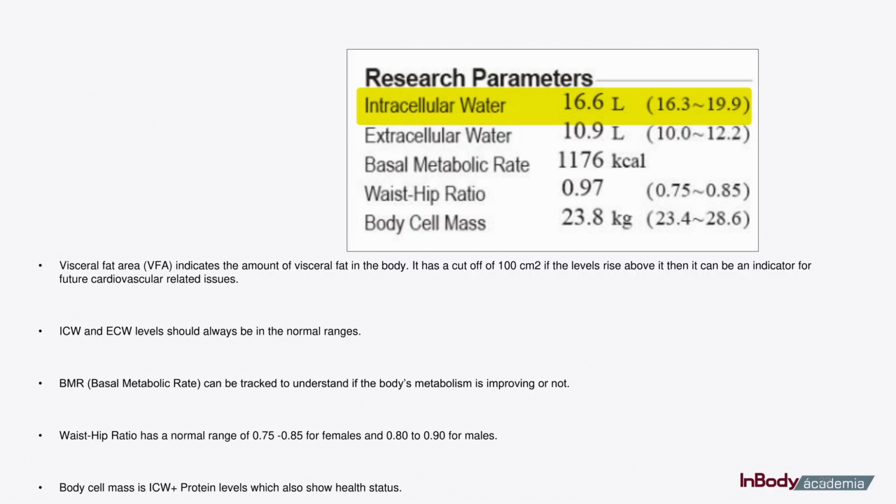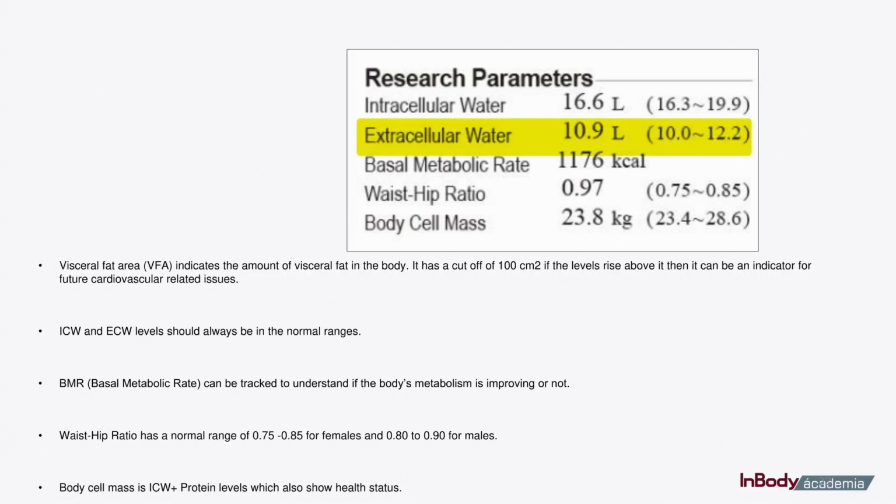Talking about the other research parameters, through the InBody report, you can actually understand how much intracellular water is present in the body. Intracellular water is the water which is present inside our cells. And also you can make out how much extracellular water is present in the body. If there is presence of more extracellular water, there can be presence of edema, which can again be assessed by the ECW ratio analysis.